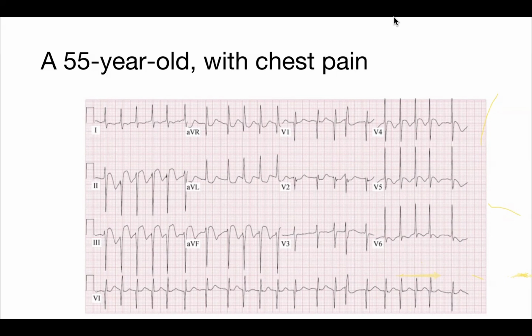And remember, when it comes to ischemic changes, what should we look for? ST elevations, ST depressions, Q waves, T inversions. Is that all?